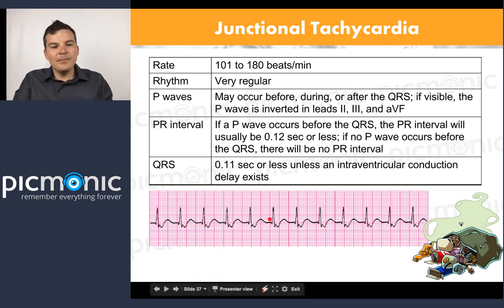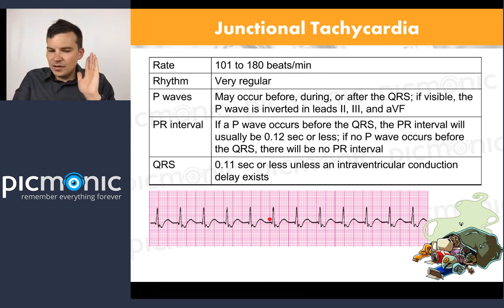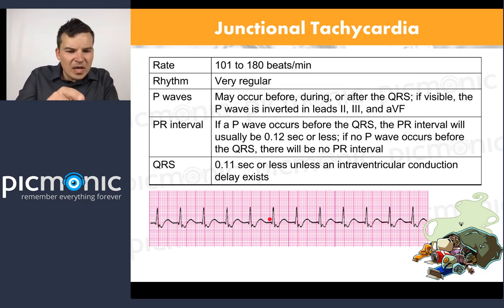So tachycardia. Then when we look at the rhythm, I'm just going to tell you right now, if you didn't already look, it's beautiful. It's regular all the way across. The R to R's are great, right? So the R to R's, regular. And then you look at the next one. You look down and you say the P waves. Is there a P wave there before every QRS? No. There's no P wave.